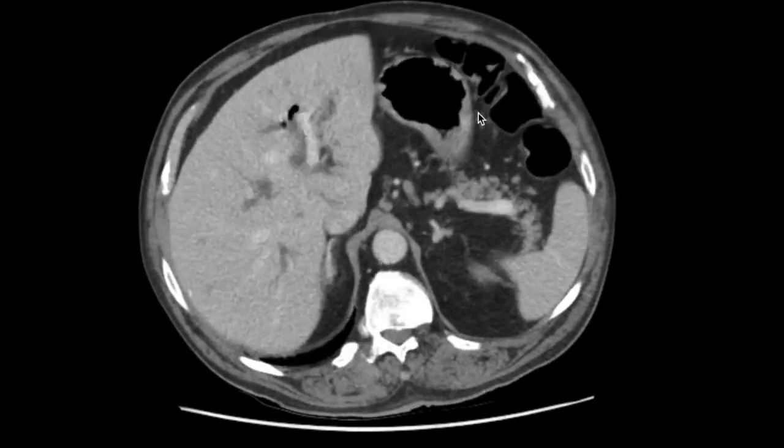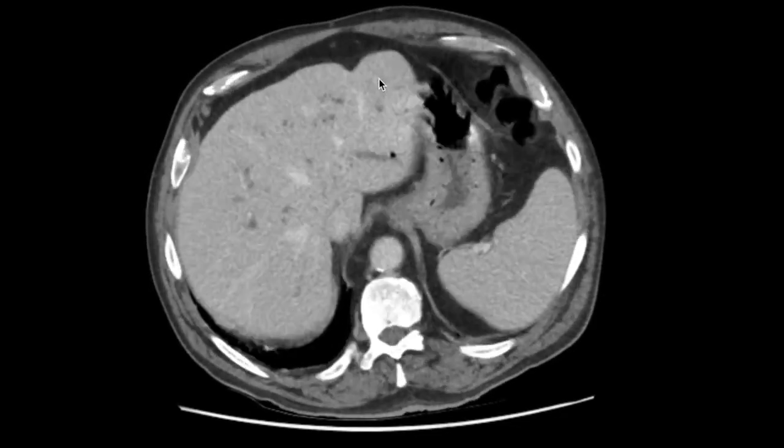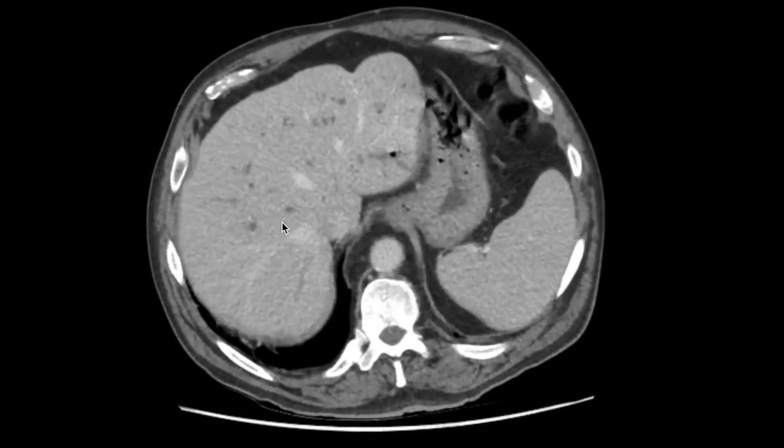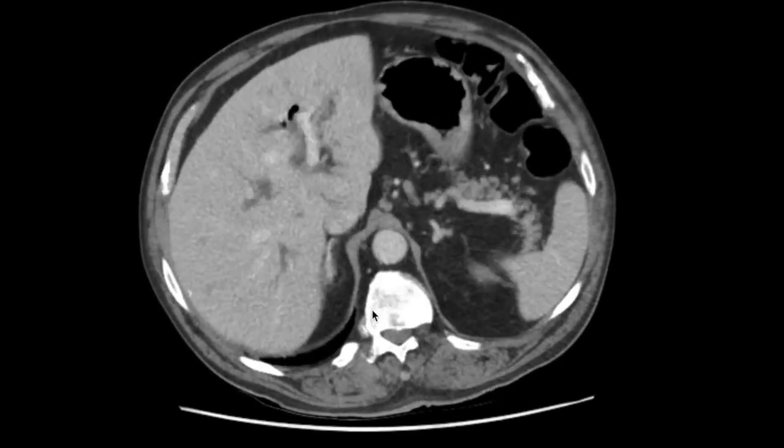And the reason why we're looking at this abnormal case is because the biliary tree is dilated here, so it's a lot easier to illustrate the anatomy. So first of all, how do we know that the bile ducts are dilated? Well, you have this hypoattenuating structure, or all of these hypoattenuating structures that are running along the portal veins. And you see that this hypoattenuating tubular structure here is on one side of the portal venous structure. Sometimes you'll see hypoattenuation on both sides, and that usually is seen with periportal edema. When you see hypoattenuation on one side that is tubular and connects, we're dealing with intrahepatic biliary duct dilatation.